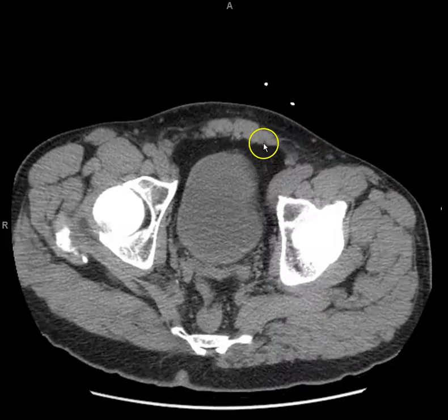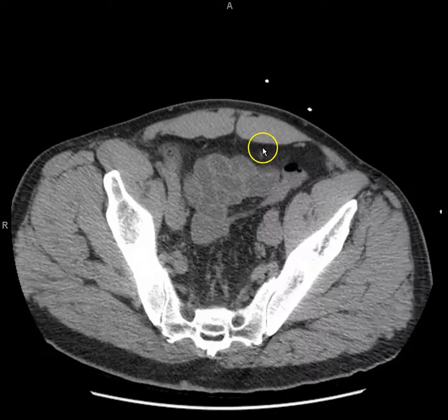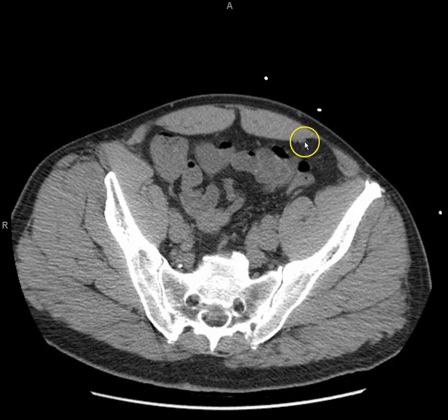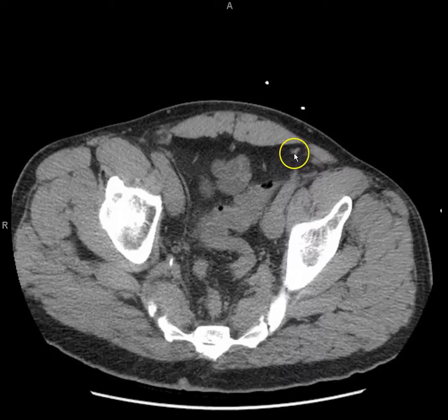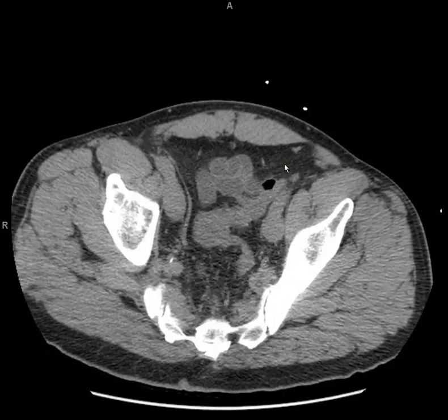So if you look here, off of your femoral, you will have a vessel that comes up behind here, right there, and that's your inferior epigastric vessels, which run along the backside of the rectus. Make sense? So medial to that is your Hesselbach's triangle. Okay.